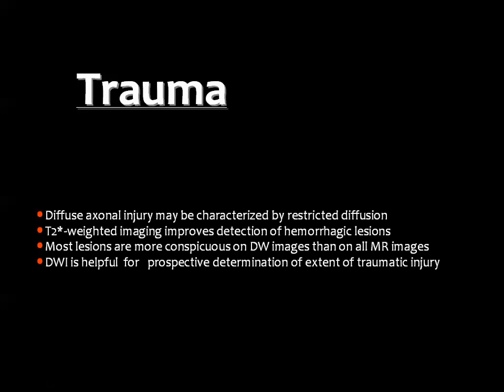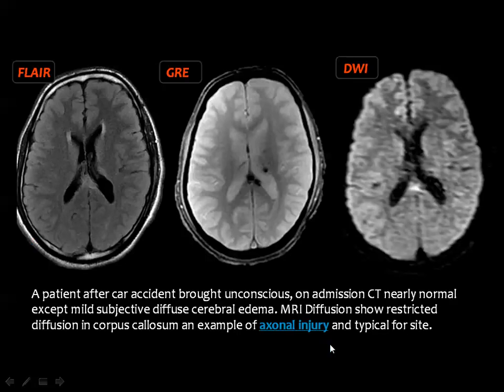In cases of trauma, especially the trauma resulting in diffuse axonal injury, actually, on MR images, you may not be able to detect the lesions. Like this is an example. The lesions appear as petechial foci of hemorrhage, and this is the FLAIR image. Gradient images are very sensitive for detection of blood, like these foci. And in cases of diffusion weighted images, the lesion may show diffusion restriction.